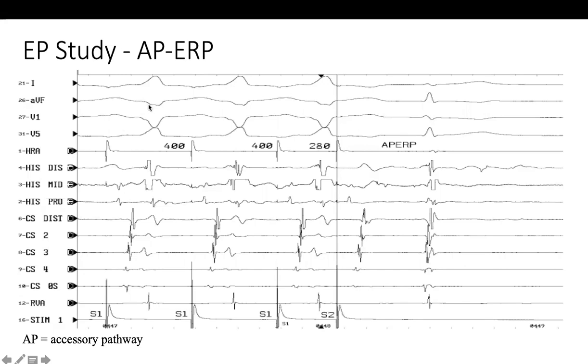The inferior leads. Again it's negative, yeah. So if it's negative, where is this coming from? From the inferior septal. Posterior or anterior? Posterior. So let us say this is right posterior, and most likely it could be posterior septum. But it could be posterior septum, or posterior, or even posterior lateral.